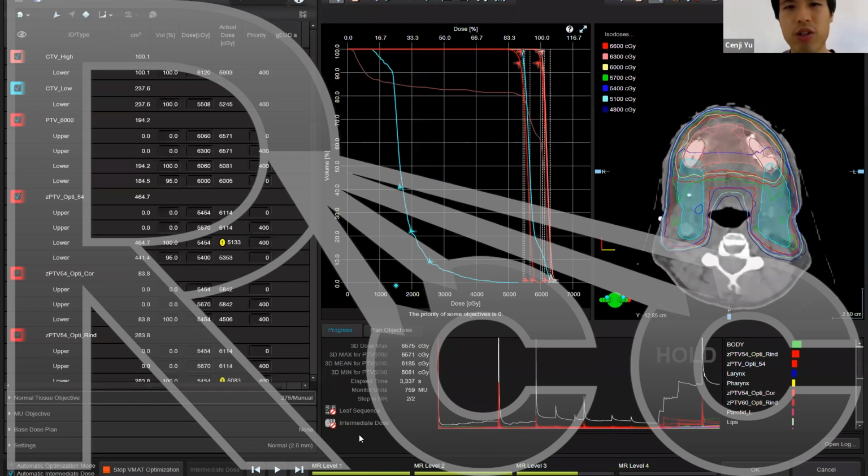The next question is, when PTV is for PTV 7000, what will be the max dose constraint for Mandible? Yeah, so I think I read that one earlier and answered that one. That will be physician preference, I think. I don't want to give particular clinical advice on exactly dose constraints or dose objectives on PTVs. Yeah, I think in that case, we see if there's any new ones.